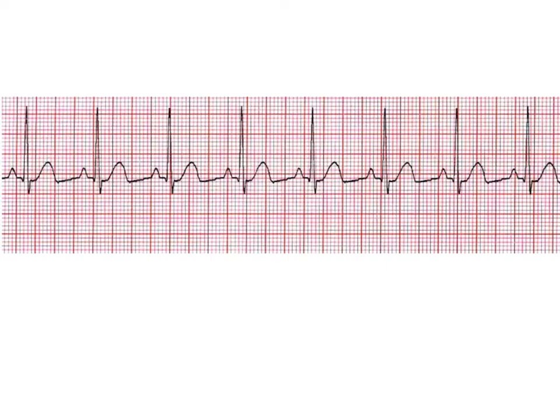Okay, so I'm going to go ahead and pull up my marker here. And as you make your way from left to right, you notice that there's a lot of bumps and a lot of spikes going on. Each of those are going to be waves. We have a particular wave there, and it tells us a certain thing. You have another particular wave there, and there, and there. All of these waves are being presented to you, and each and every single one of them actually has some importance. Let's go ahead and try to identify some.